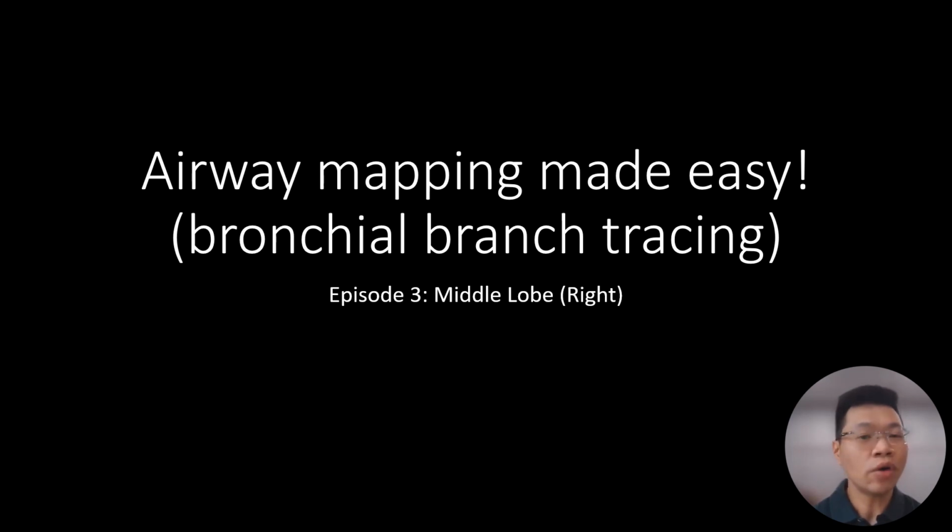Hello, and welcome to the third video on airway mapping made easy, the video tutorial series where I demystify the art of converting a CT thorax into a hand-drawn 2D map of the airways for bronchoscopy. I'm Pip, an interventional pulmonologist from Woodlands Health, Singapore, and in today's video, I will be taking you through an airway map of the middle lobe.